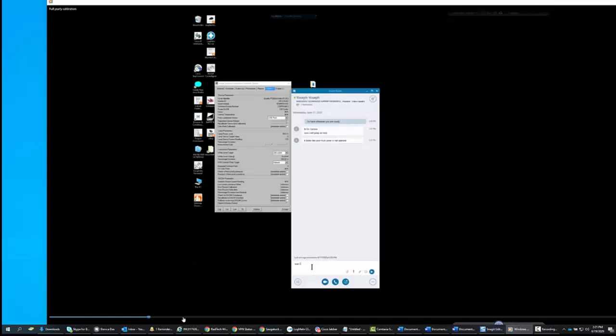Notice here, I'm going to pause this video. Please remove the ambient diffuser. So you basically ask the radiologist to remove the white cap from the sensor, so the lens will be exposed and they will be able to put in the puck in the center. This will time out, or you can just abort it. Ask them to open the cover and you will simply click that recalibrate to DICOM standard once again.